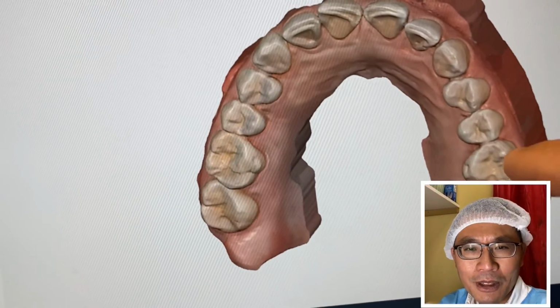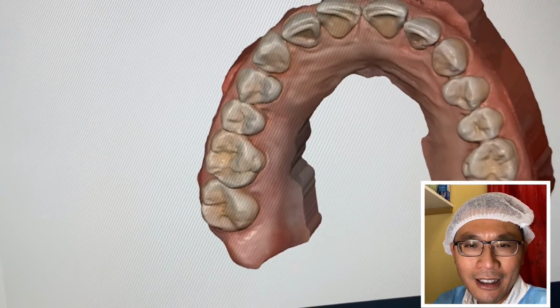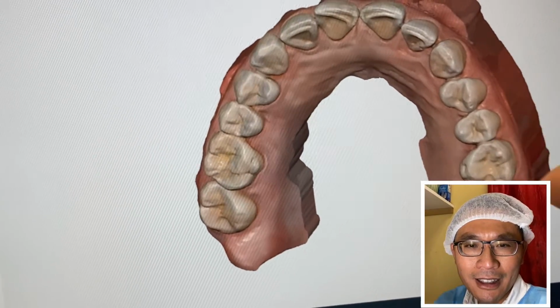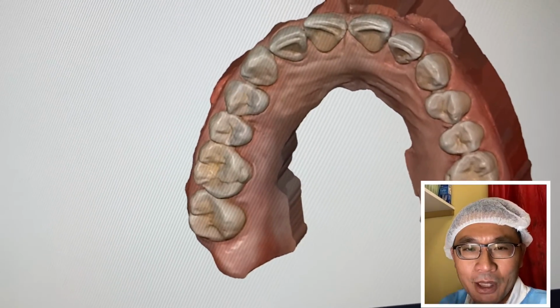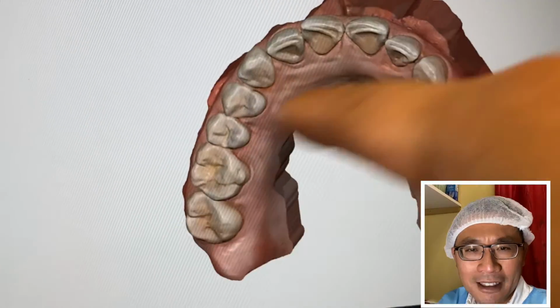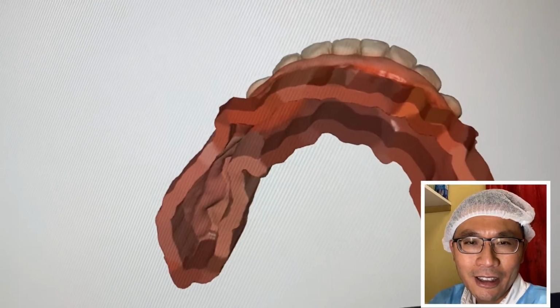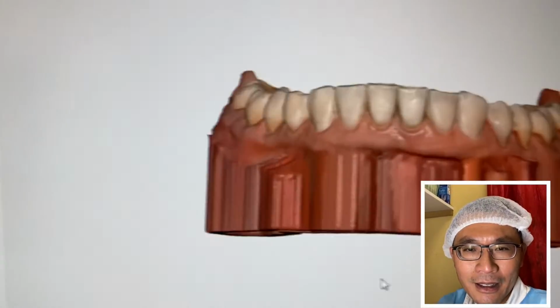That's because there might be a small rotation of the 14 toward the mesial and a small rotation of the 13 toward the distal, so it creates a very pointy contact. Orthodontically, we can correct that and help create a better, smaller arch, which would help it connect with the bottom teeth. I'm going to show you right now what's going on.